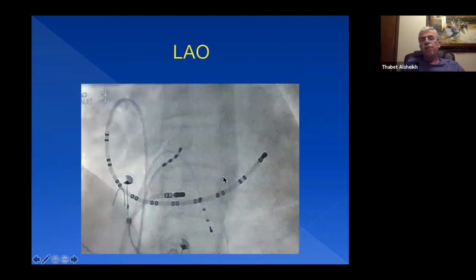Now, if we have a focus that's firing inside the atrium, whether the right atrium or the left atrium, how are we going to decide where it is? Well, one way is to put a catheter with multiple electrodes. The most electrodes we have on one catheter is 20. Usually 1, 2 is distal, 3, 4 go proximal all the way to 19, 20. This is a duodeca catheter, 20 poles.